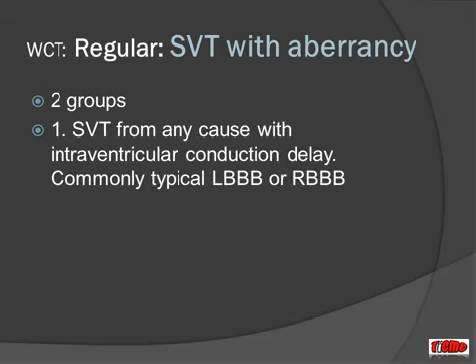Firstly, there is SVT from any cause which has an intraventricular conduction delay. So there is delay within conduction in the ventricle, and commonly you get a typical left bundle branch block or a typical right bundle branch block manifesting in the ECG.